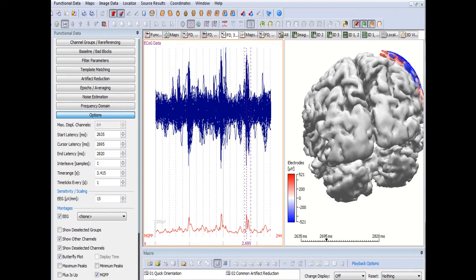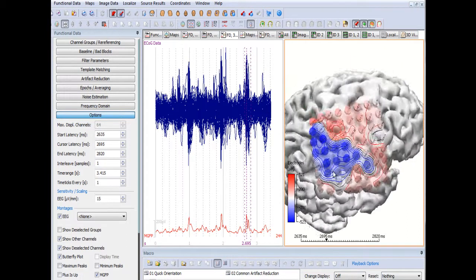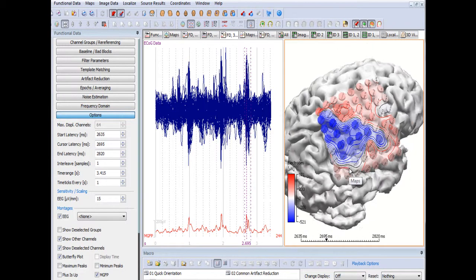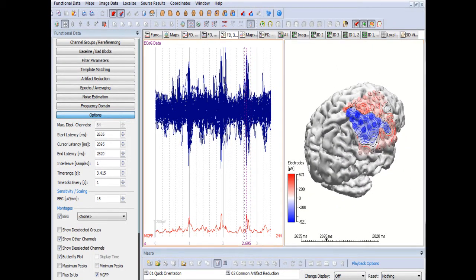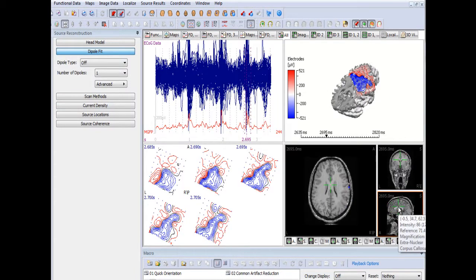We can rotate the brain in 3 dimensions. We can adjust the geometry of the grid relative to the brain. We can align it for an optimum view of the surface of the brain. We can adjust the size. We can isolate the grid. We can show the structural image of the brain activity, and we can do cross slices through the brain.